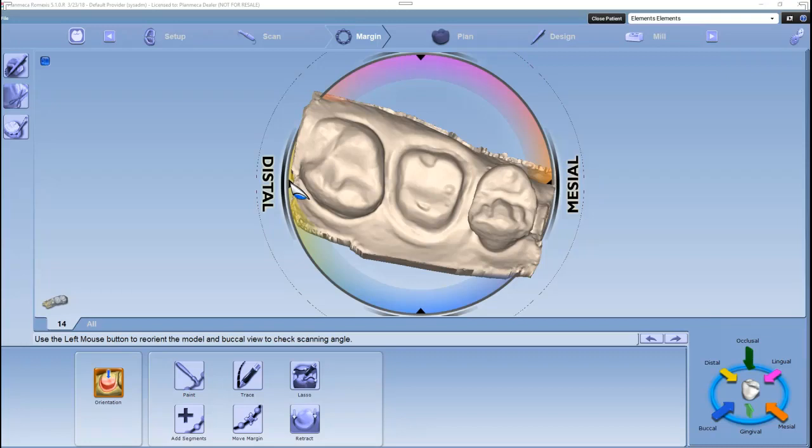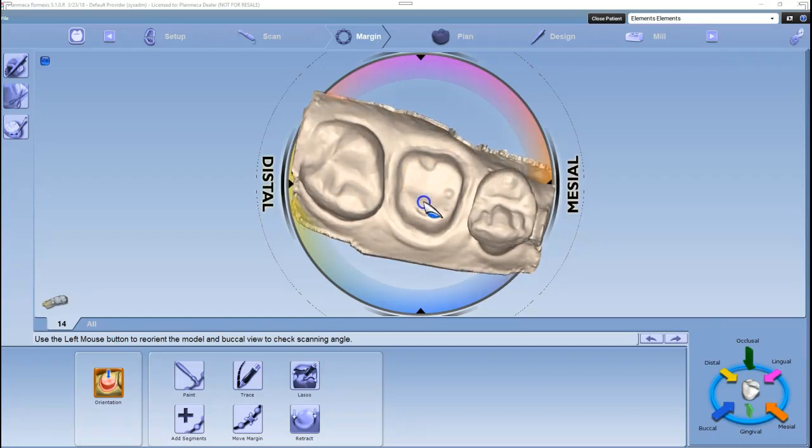It can be adjusted easily with 3 views: occlusal view, distal view, buccal view. You may have also heard the abbreviation ODB, which stands for the 3 views that we will use: occlusal, distal, buccal. First, in the occlusal view, to set it correctly, we will left-click and hold to balance the model, buccal and lingual. This means I want to see the same amount of the buccal-lingual walls of my teeth.